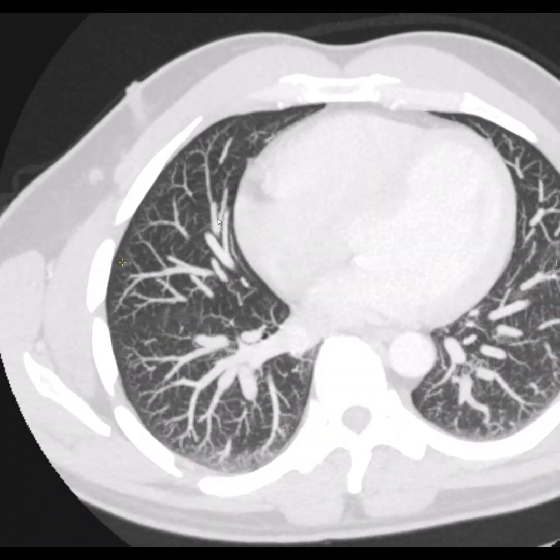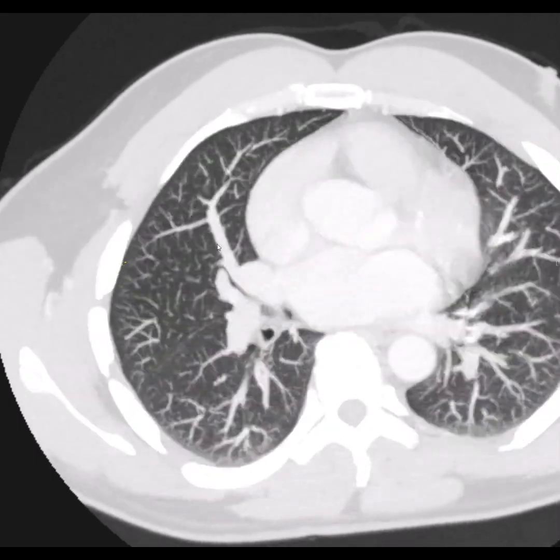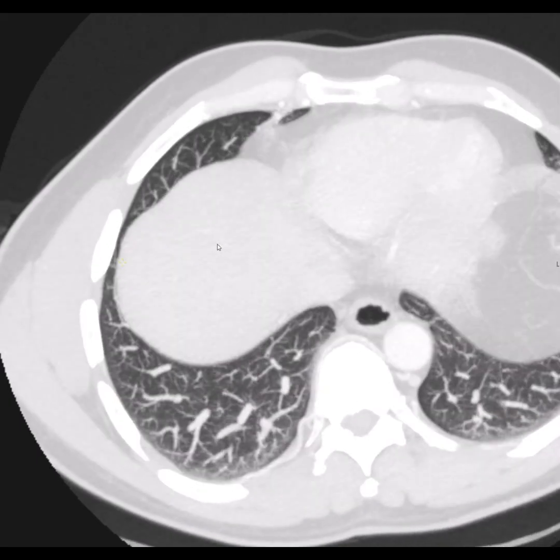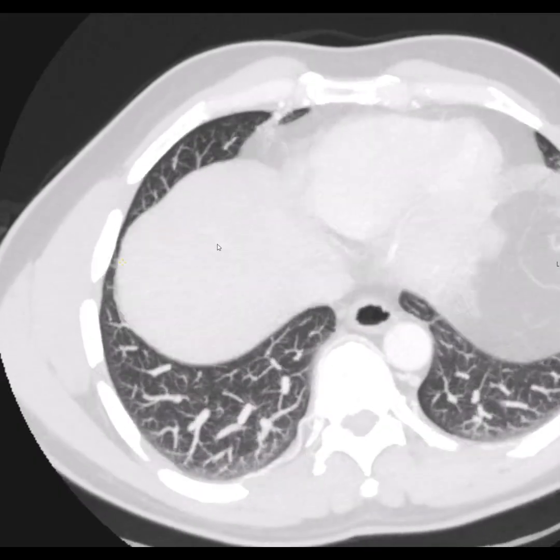Going back to the MIP, working my way through the rest of the image, looking at that middle lung region on the right lung, everything looks normal besides that one nodule. Same thing for the right lower lung. Walking through, everything looks normal here, no nodules.